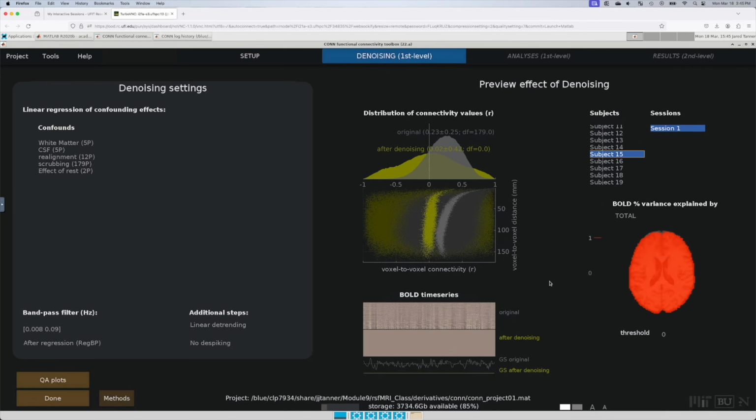And so there's actually some challenges with this data set, but we're using it because it's sort of an interesting one. These are brain tumors, meaning participants who have brain tumors, and so there's the issue of the brain tumor there in the data, and that throws things off. And we're just going to assume that these are all good to use, which is not necessarily the case, but for our purposes, that'll be it.